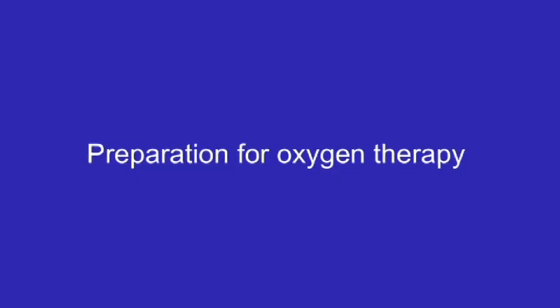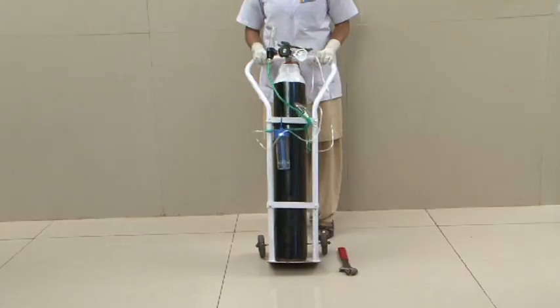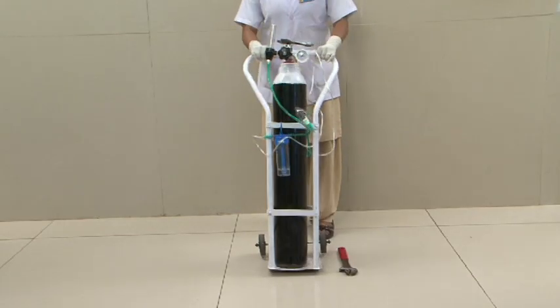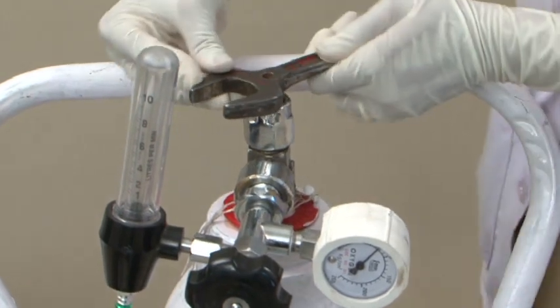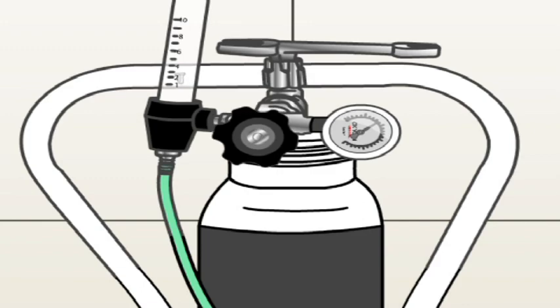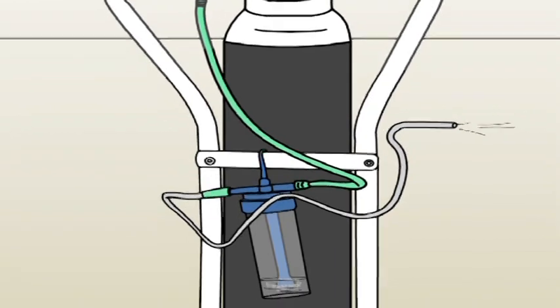Preparation for oxygen therapy. Oxygen cylinder. Please ensure that the oxygen cylinder in the trolley is secure and will not fall over. The knob or valve is opened easily with a spanner. The regulator and gauge are directly connected to the oxygen cylinder to reduce the high pressure in the cylinder and keep the flow constant as oxygen is used.